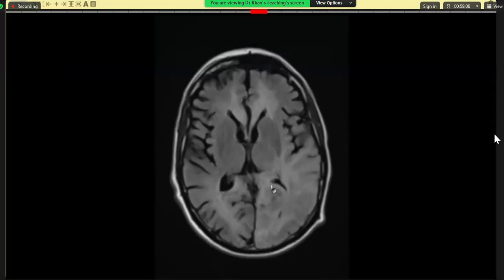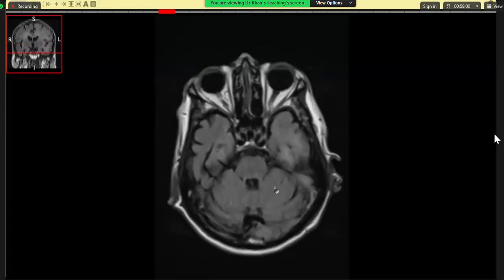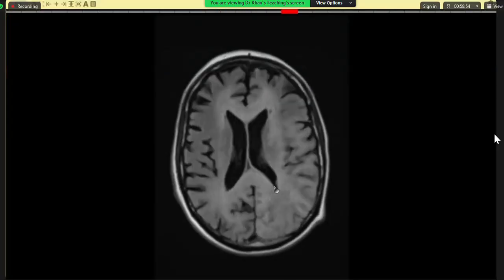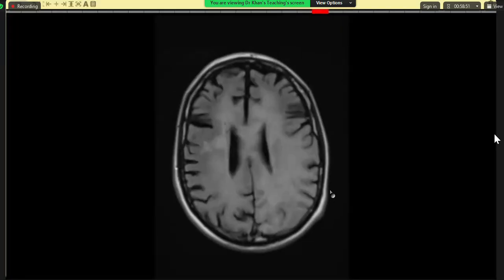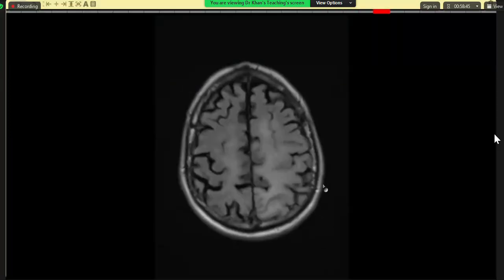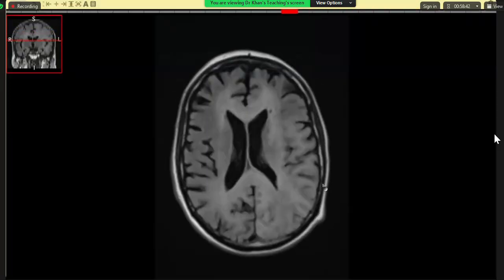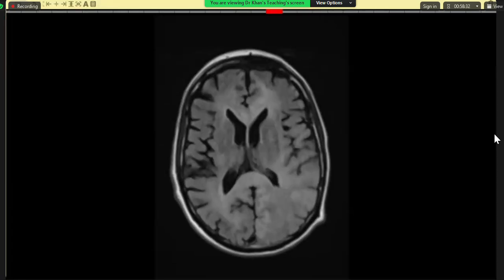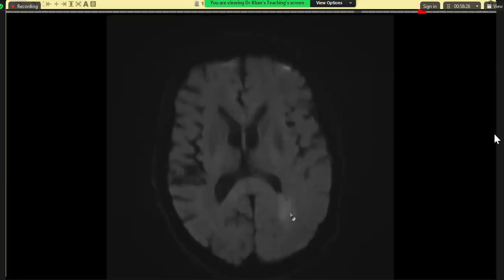Usually in white matter diseases like, let's say, demyelination, there can be cortical involvement, by the way, we know that, but not to this extent. But herpes simplex, okay, fine, that will be. Look here, how impressive it is. Whole of the gray matter is involved as well as white matter. You will agree that the architecture looks sort of normalish, and on DWI sequence, please remember that even gliomas can cause what we call restricted diffusion. And there was a bit of, I think, restricted diffusion here with low ADC.